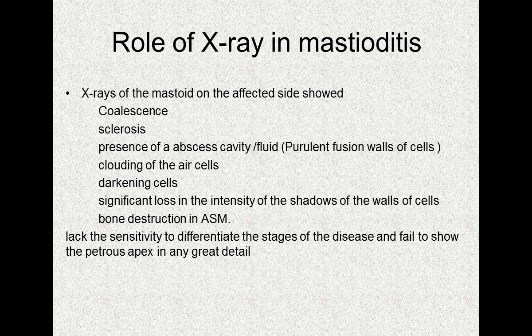X-ray lacks sensitivity to differentiate stages of the disease and fails to show the petrous apex in any great detail. This is the role of X-ray in mastoiditis.